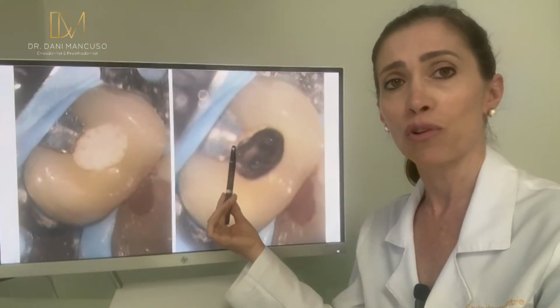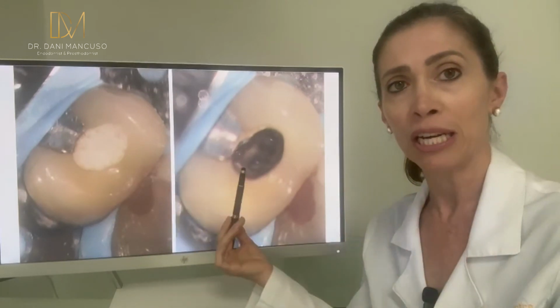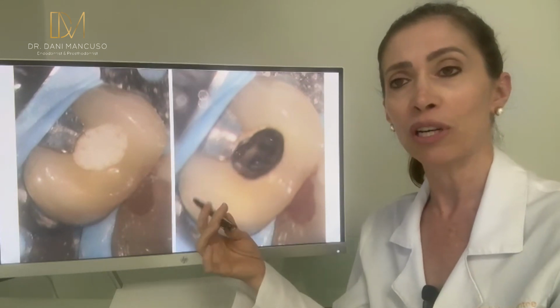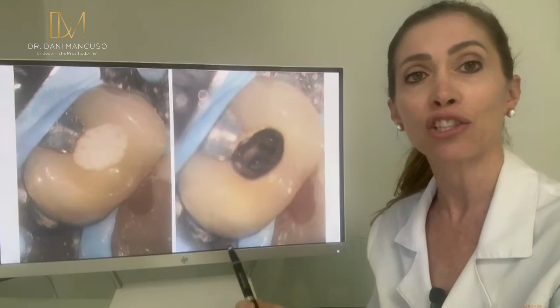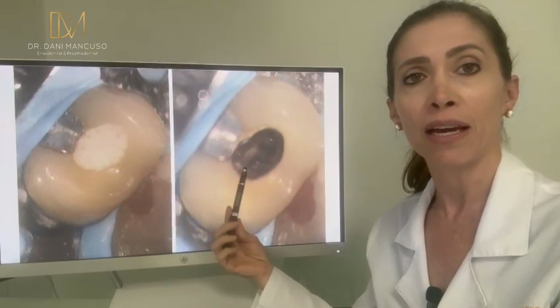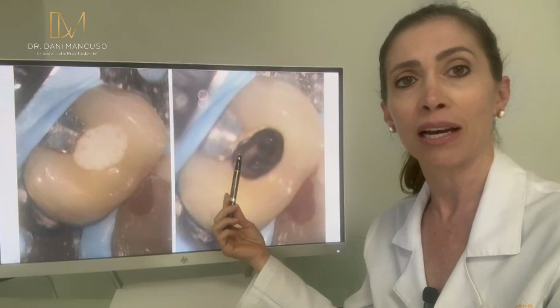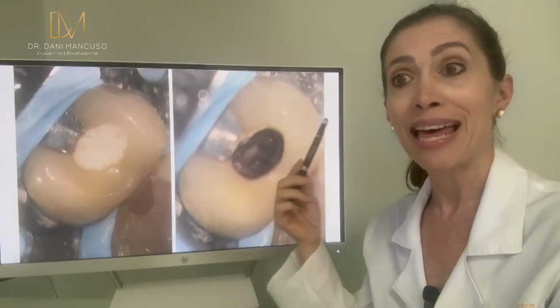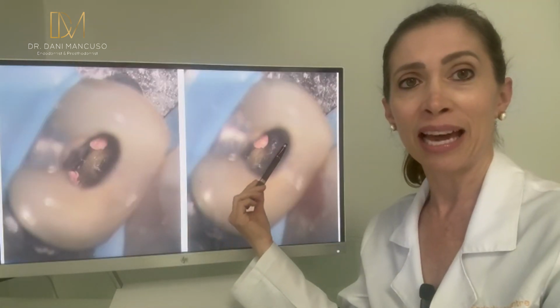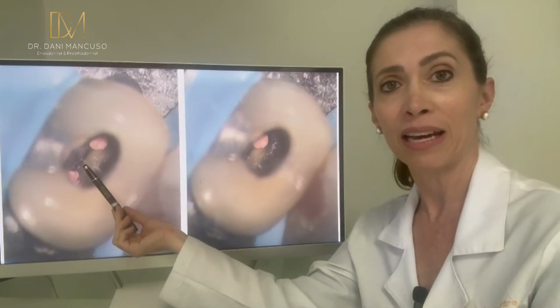Clinically, I think the dentist was trying to move away from that metal of the bridge and went a little bit more towards the mesial. And when he drilled, I think he drilled in a direction that was going too mesially, because it doesn't look off here, but it looks off there. And if you pay attention, there is a dark line going in that direction here. That's where the canal is, and let me show you. Now you can see that that's where the dentist was drilling, and that is where the canals were.